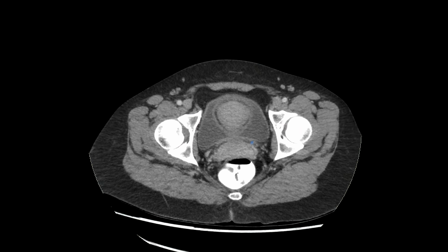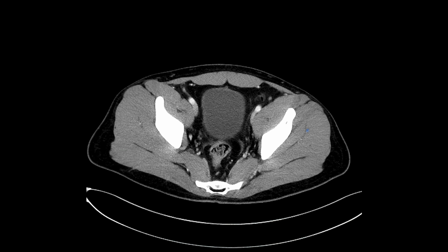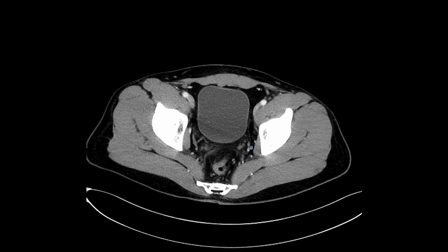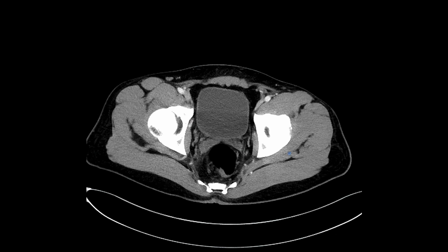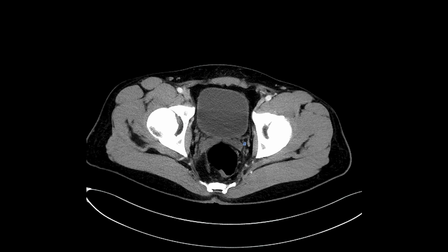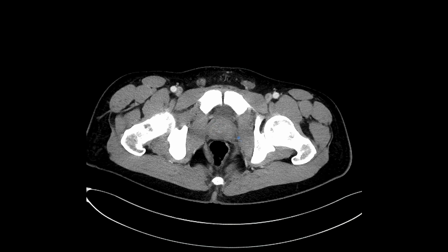Jumping over to a male pelvis here, we have the rectum here. We have the bladder anteriorly here. So the most dependent space here is called the rectovesical space. Oftentimes when we're describing free fluid here, we just say free fluid in the pelvis. Here we have the paired seminal vesicles and the prostate inferiorly here, but we'll talk about the organ anatomy in a bit.